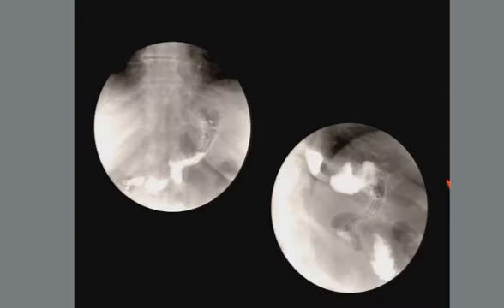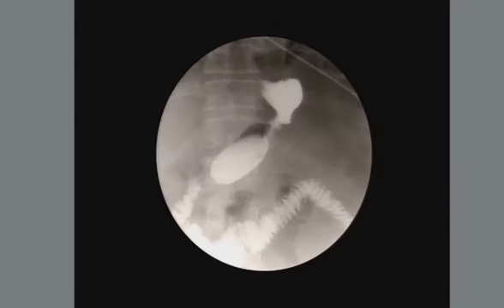And we'll end with gastric sleeve. A gastric sleeve is tubularization of the stomach to decrease its capacity with resection of the greater curve. And these are the areas that we need to look here for leak. Again, we also need to confirm there's emptying across the duodenum.